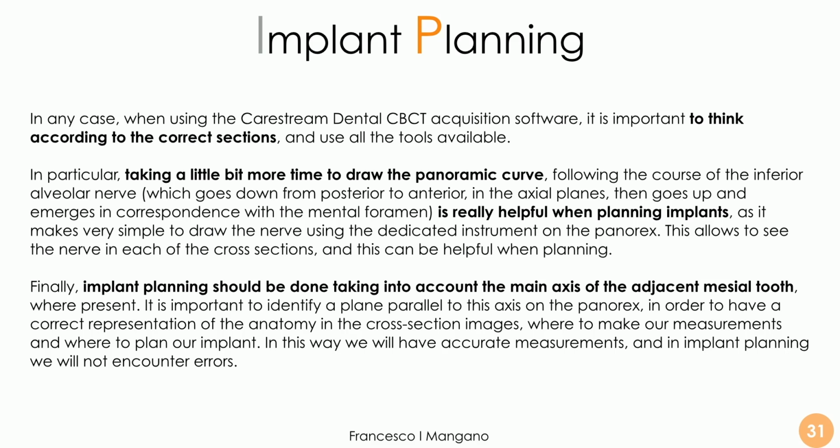That blue line inside the software is very important, it must be tilted correctly in order to follow more or less the inclination of the mesial tooth, considering also the Spee curve and the Wilson curve. So that way we will not encounter any error.